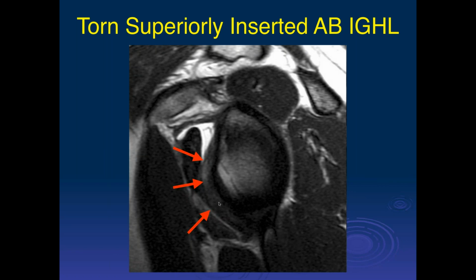So, how common are these? It's not all that common that they masquerade as a tear, but we see them fairly frequently. If you look for them, you'll see them. I don't always point them out because they aren't issues most of the time, but sometimes they can be.